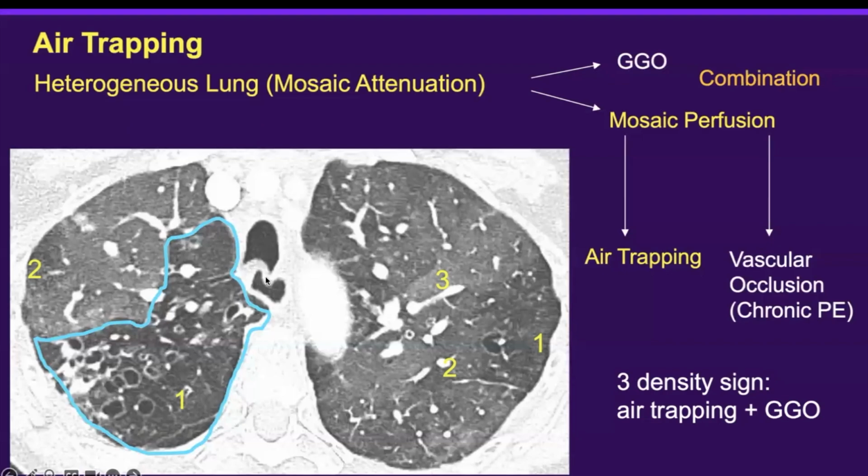And notice how there's inward bowing of the trachea, indicating that the patient may not be in full inspiration, and therefore this accentuates the air trapping. And these are the nodules and bronchi as mentioned.